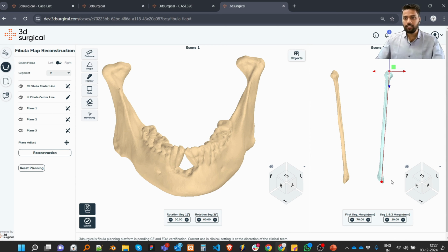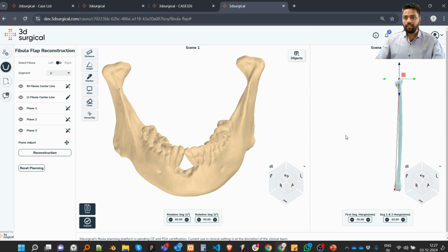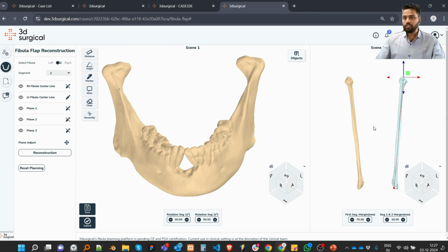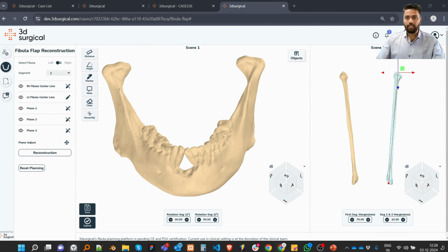Okay, so let me click here. I will try to change the position. I will click this point and change the position. And then similarly in this view as well. First of all, I will click here and change the position. Simple. Okay, so it is fine; above, it is not the best fit. In the particular area where the segments will come, the center line should become as much as possible the best fit. So simply, as you can see, the center line has been created.